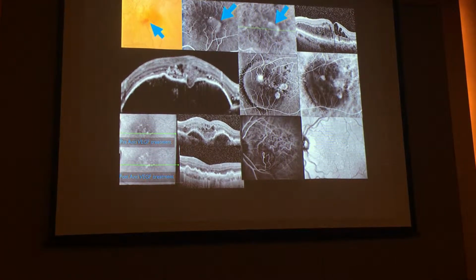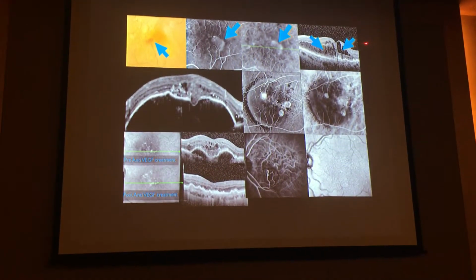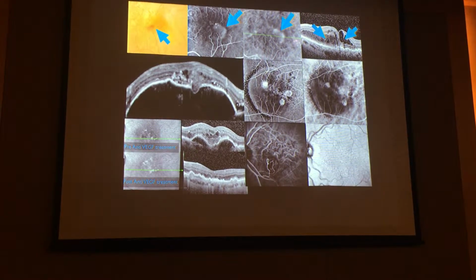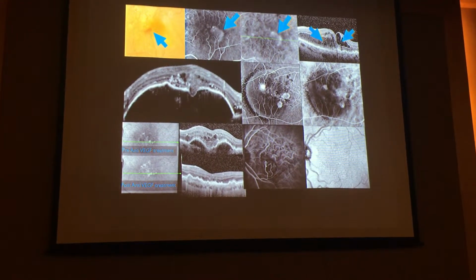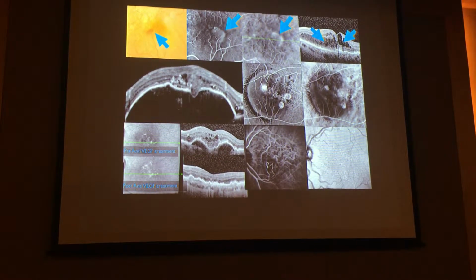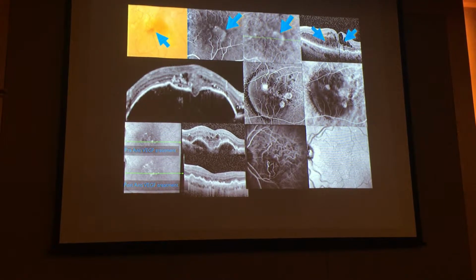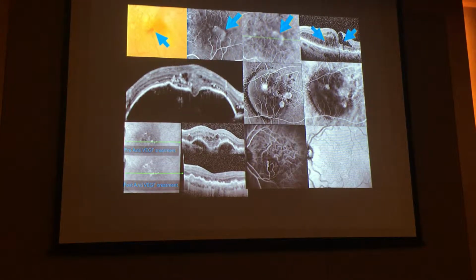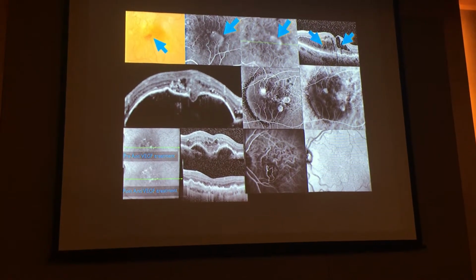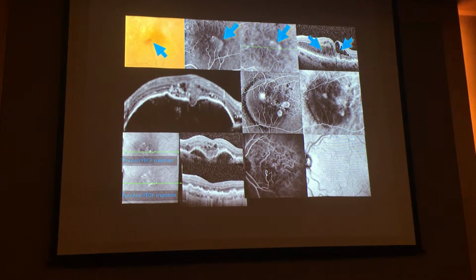Then, if you have in OCT intraretinal cyst without retinal, neuroretinal detachment, you have to think about a RAP lesion. Of course, none of these signs alone gives you the possibility to detect it, but putting two or more together is helping you in doing the diagnosis.